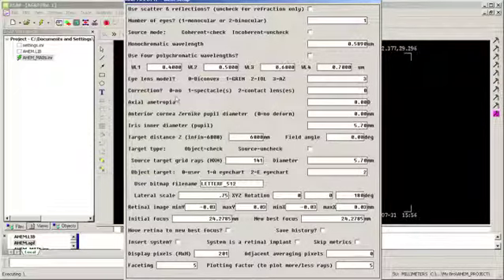Here I have an eye lens model choice. I can choose either a simple biconvex equivalent index lens that's controlled by power, or a gradient index lens, which is a complex shelled gradient index lens. I can insert an intraocular lens, an IOL, or I can use the Arizona eye model. So I'm going to choose that.